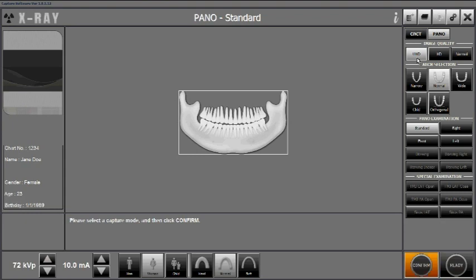Due to the size of the file, this will also affect the amount of time needed to recreate these images. For instance, normal is between 3 and 5 seconds of processing time, HD between 5 and 10 seconds of processing time, and UHD between 15 and 20 seconds of processing time. The most common option is HD, or high definition, which is a 13-second scan and roughly 3 megabyte image size.